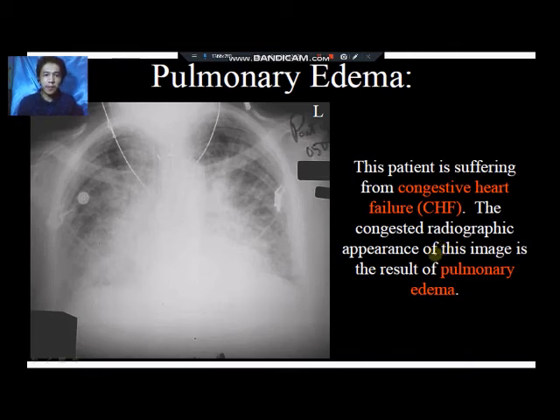Okay, so if ever na ay pulmonary edema tong patient, again related to fluid accumulation, then the appearance will be lucency, will be opacity. Now, consolidation gihapon kibali medyo nag-increase ang opacity or mag-increase ang opacity sa ato ang lung tissues. So the patient is suffering from congestive heart failure or CHF.